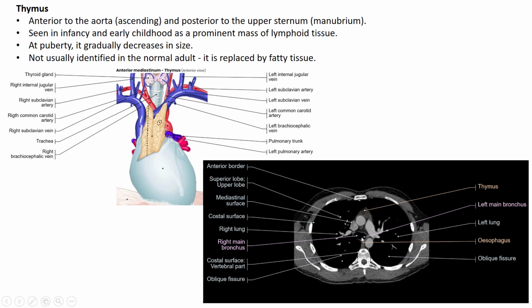So it's just at the carina where they have not split into two yet. So that's a beautiful picture of that. The esophagus here posterior to the trachea, and the spine posterior to the esophagus. You have the ascending aorta and the descending aorta. Again, the pulmonary trunk as it's just beginning to bifurcate, and then the thymus is here in the front.